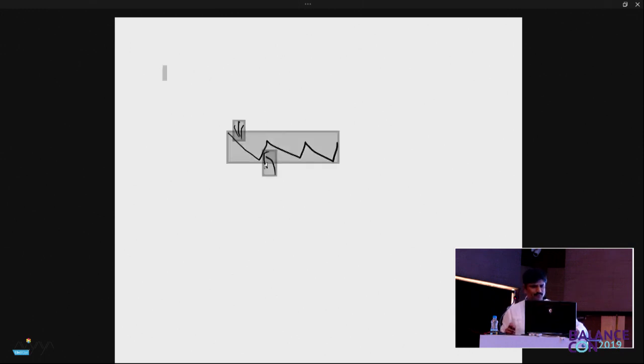But you have to report first if that case has a spontaneous nystagmus or not. Yes, sir. There was a spontaneous nystagmus in that case. So this is the spontaneous nystagmus. We see it in patients with spontaneous nystagmus, not because of optokinetic. It is because of the underlying vestibular tone asymmetry, which gets manifest in the spontaneous nystagmus.